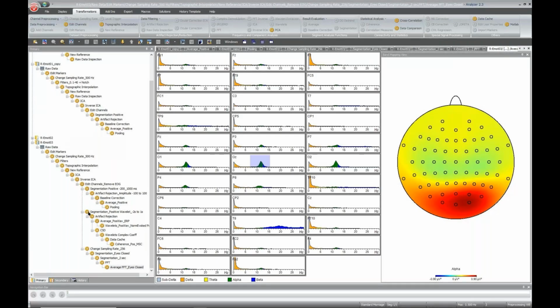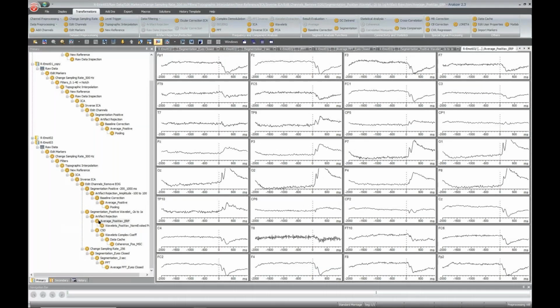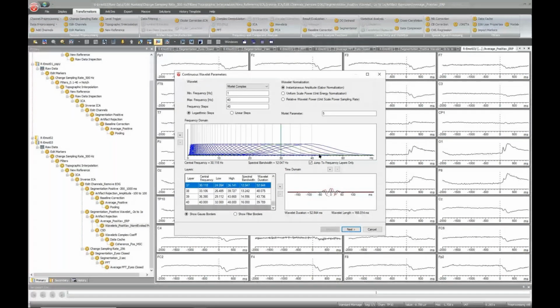Then I would like to show you here our branch for the wavelet, where you can observe we obtained a longer baseline, which we had already since the experimental design. And this baseline will allow us to follow the recommendations for wavelet analysis. So first, we obtain here our ERP, which is as before, but with a longer baseline. And finally, for the wavelet analysis, let me reprocess it. Here we defined the parameters for the wavelet analysis, which we cannot go through right now.